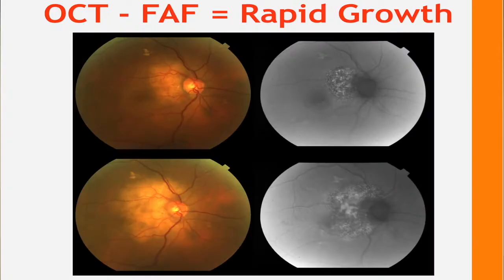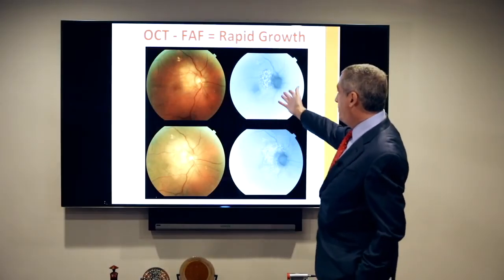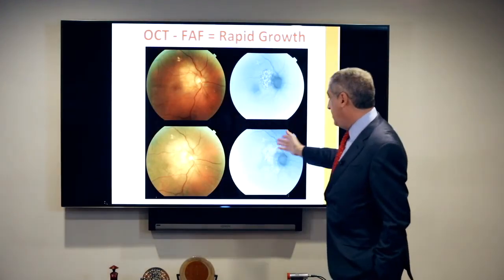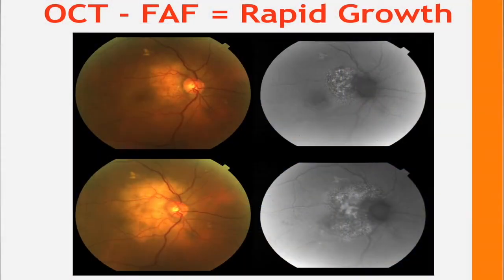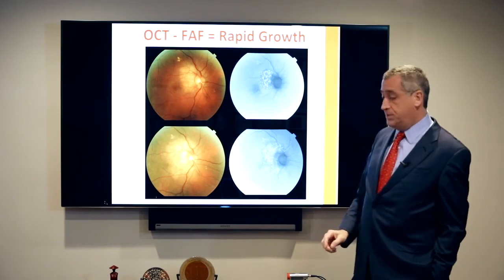Here's another example of watching a small metastasis. Here we have a rather atypical tumor, but it really doesn't strike you as being necessarily a metastasis. And within several weeks, the tumor has expanded, and the pattern of fundus autofluorescent imaging and consuming of the retinal pigment epithelium has progressed. You can see the RPE here is still somewhat intact, and by the time the month went by, this whole thing is dark and has been already destroyed.